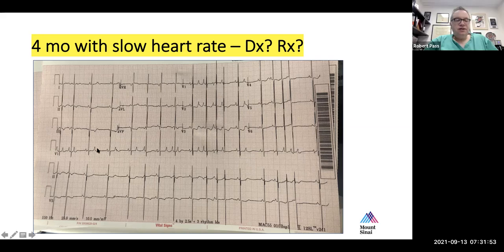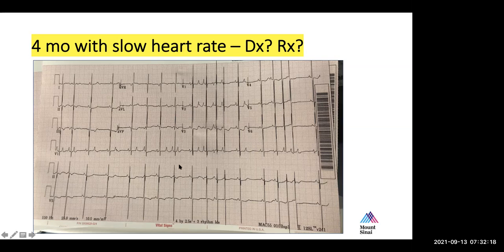Right. So there could be what they call concealed conduction into the node on some of these, which is causing slowing. And the sinus rate would come out if all this atrial ectopy at such fast rates went away. So paradoxically, if we got rid of this fast atrial rate, having a slower atrial rate would result in a faster ventricular rate, because these A's are so fast that they can't actually conduct.